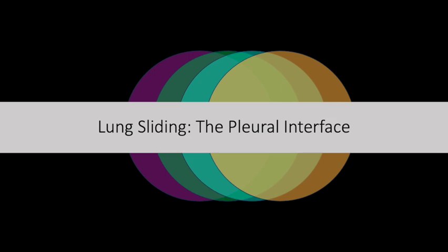This lesson focuses in on the topic we introduced in the last lesson about how the pleural interface, or in other words, the transition point at the junction of the thoracic wall and the thoracic cavity, influences our ability to visualize the lung or make inferences about its health. Now, we're going to zoom in a little bit more and look at the pleural line and consider some diagnoses that disrupt the normal pleural interface.